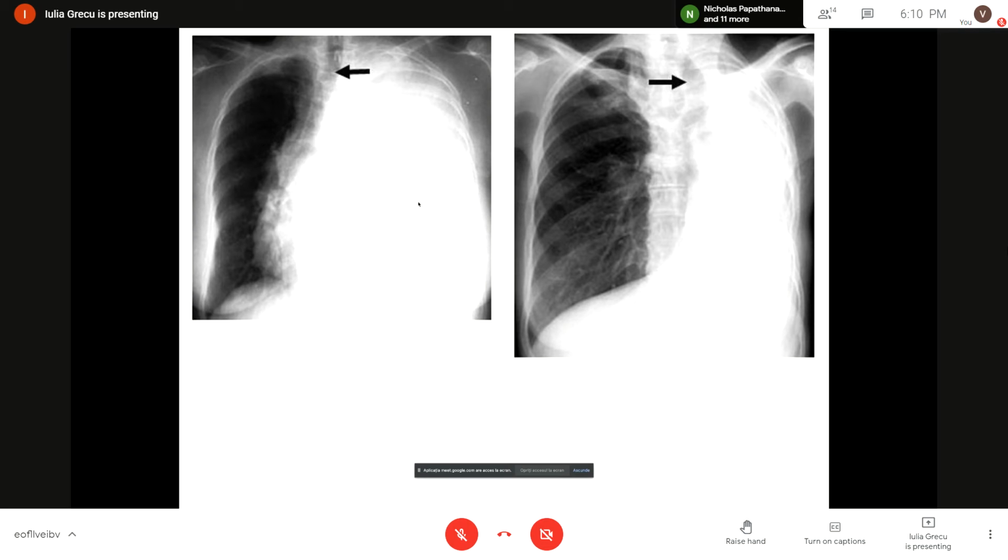We have to firstly, and especially on the chest x-rays, determine whether it is pleural opacity, and if it's pleural opacity, if it's pleural effusion, if it's a tumoral process, or if it's air, for example. So this would have to be your first diagnosis. It is a massive pleural opacity, most probably given by a very important pleural effusion.